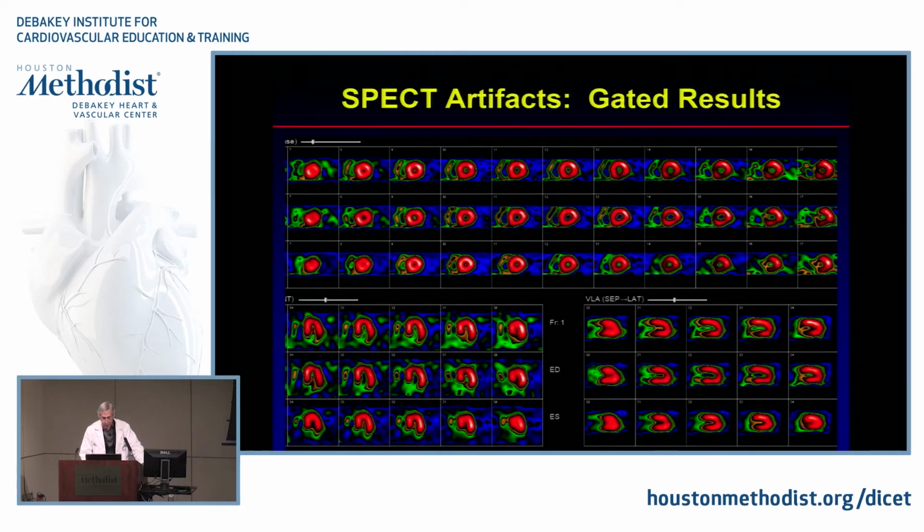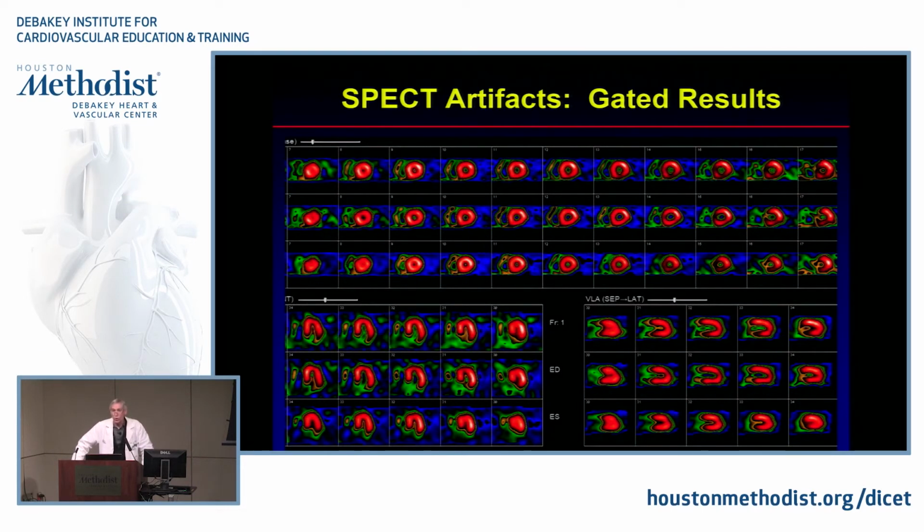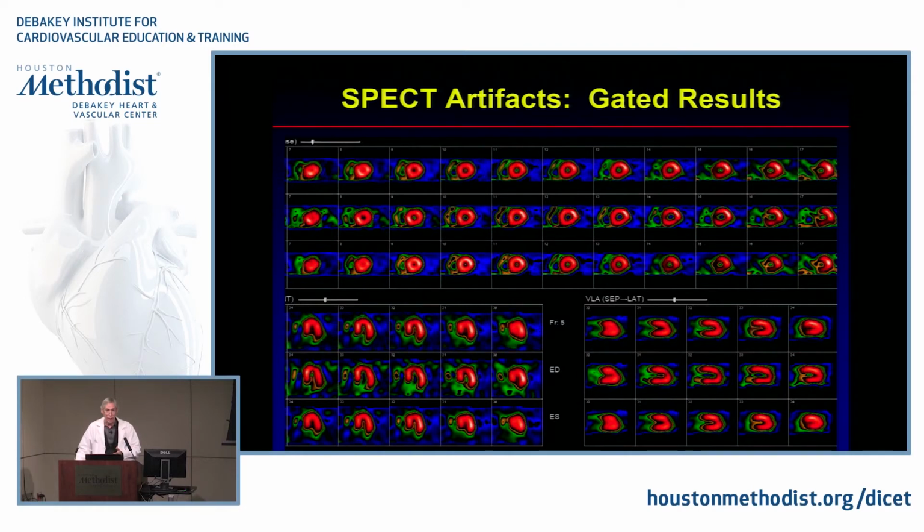Now the other take-home message from this is to always look at the ejection fraction. And if you look here, you can see this patient has normal ejection fraction, right? So if the patient had abnormal ejection fraction, that would be a tip-off that, look, this is some actual problem, prior infarction potentially, etc. But the fact of having normal regional wall motion in the areas particularly where you have a potential artifact that clears would indicate that this is artifact rather than real.